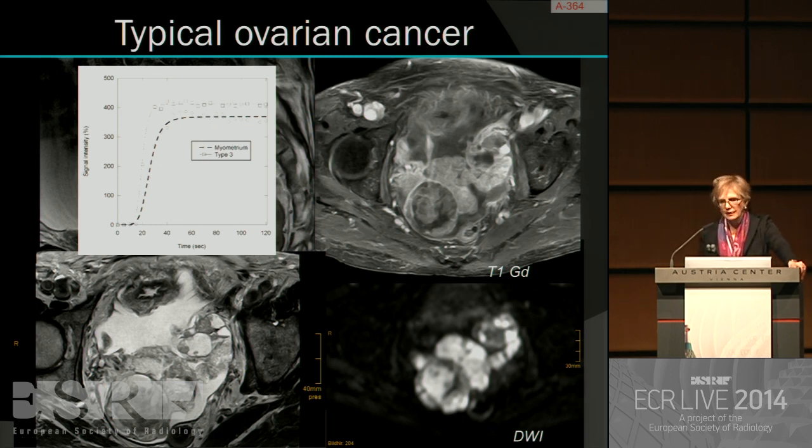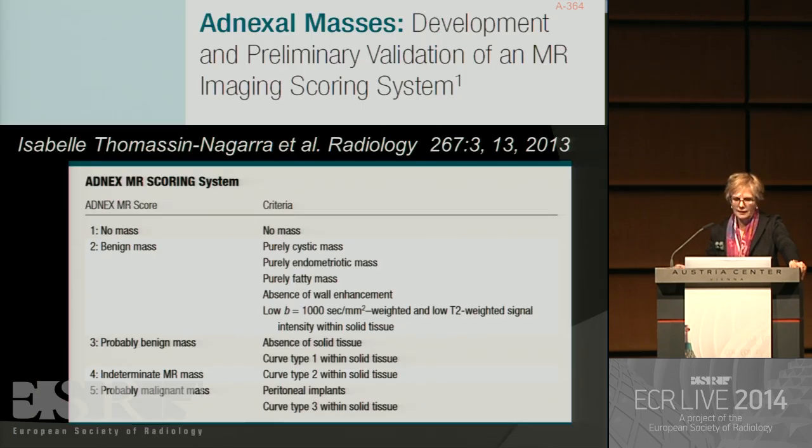And it seems that, again, Isabelle Thomassin-Naggara's paper will help us to overcome the difficulty to differentiate between malignant and benign tumors that may mimic cancer.